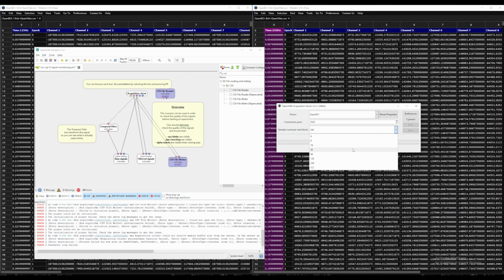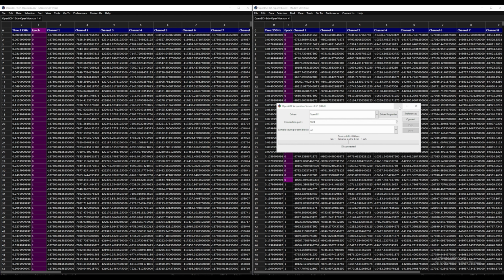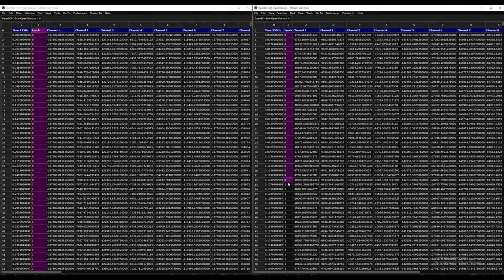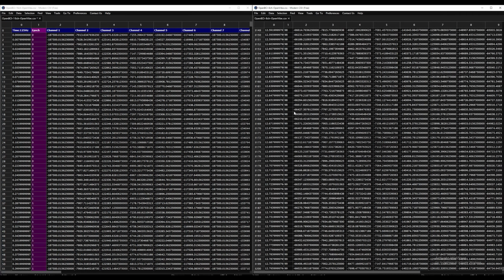It always operates in blocks and always expects the same number of blocks for every recording. And as you can see here, there is no difference between a 250 Hertz sampling rate file or 125 Hertz. It always sends the same number of blocks based on what is designated here, and the device doesn't really make a difference, which is also good news, because that means we can also easily create our own epoch column, but we just have to make sure that they end with a complete block. Otherwise, OpenVibe will crash when it reaches the end of your file.